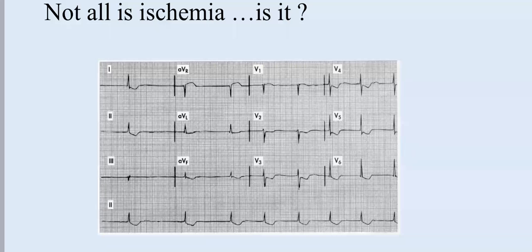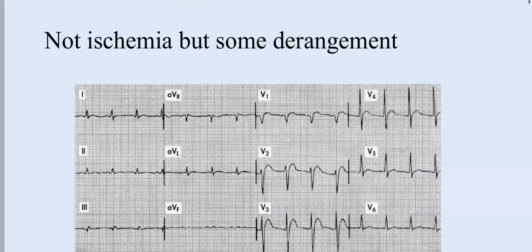Of course, there are other forms of arrhythmia which are characteristic of digoxin toxicity. But when we talk about digoxin effect, we are just talking about this reverse tick sign or scooping, and that's it, nothing more. Okay, so back to this one.